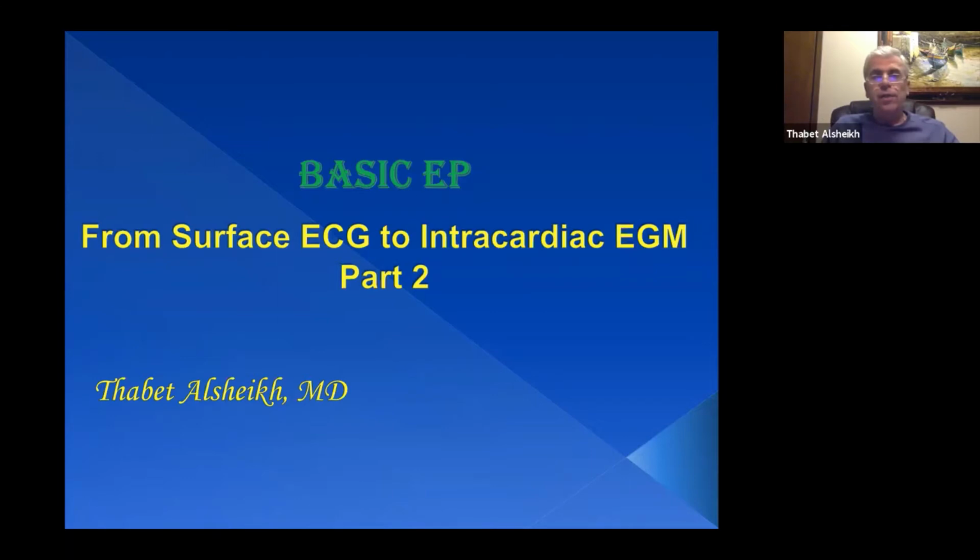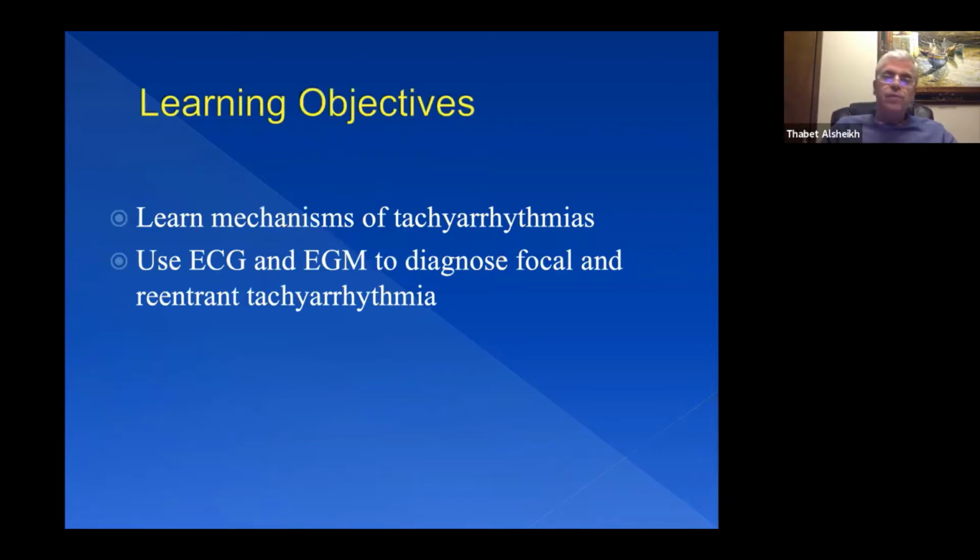This is part 2 of the basic EP lecture series. The learning objectives for this morning's lecture are to learn the mechanisms of tachyarrhythmias and to be able to use the surface ECG and intracardiac recording to diagnose the mechanism of arrhythmia, whether it's focal or reentrant.